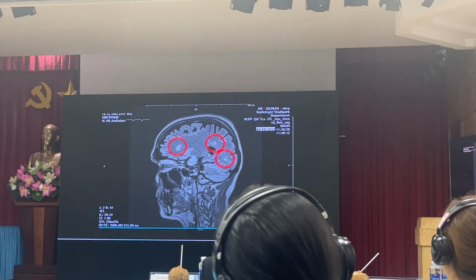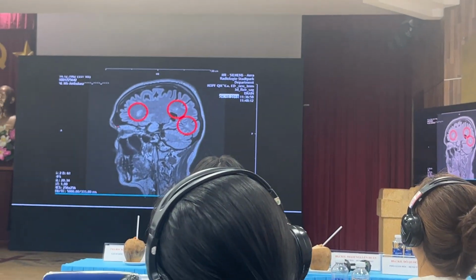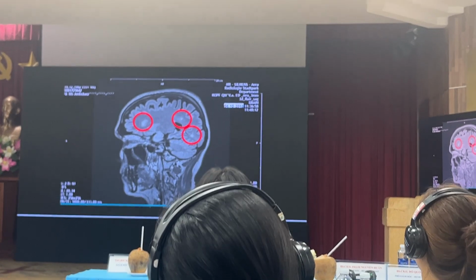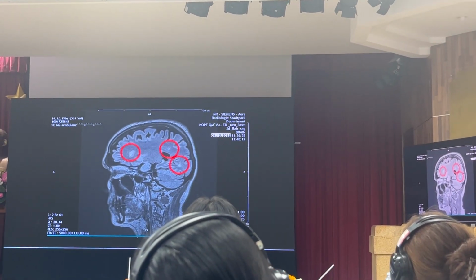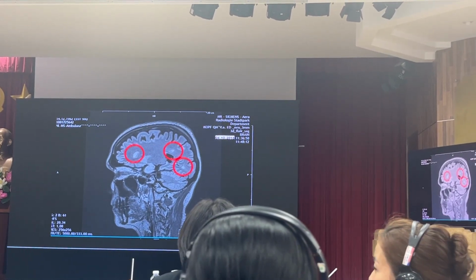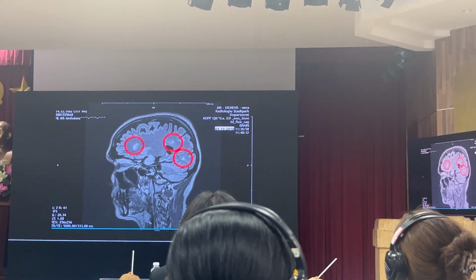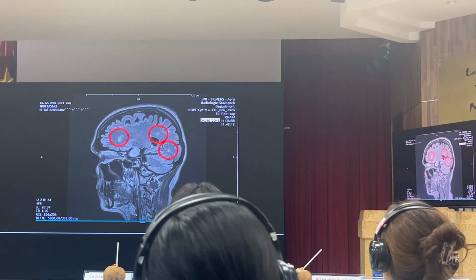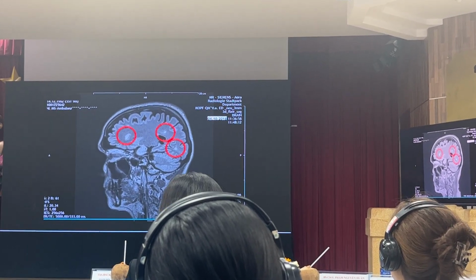And what they found is already white matter lesions in the brain. So this patient had multiple sclerosis without neuritis, with affection of the ganglion cells, the first feature of the beginning multiple sclerosis. So OCT helps us to be more sensitive to detect such diseases and not send the patient away saying you have dry eyes.